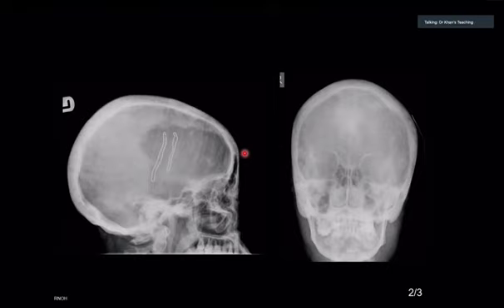The second thing is that there is a type of fibrous dysplasia which we call the Pagetoid type. In fibrous dysplasia also the confusion is that it can be lytic, it can be sclerotic, it can be mixed. So the Pagetoid type is something you will find difficult, but the main discriminator is age as well as the anatomical bones which I have talked about. Both of them can take up on nuclear scan, so that is not a discriminator.